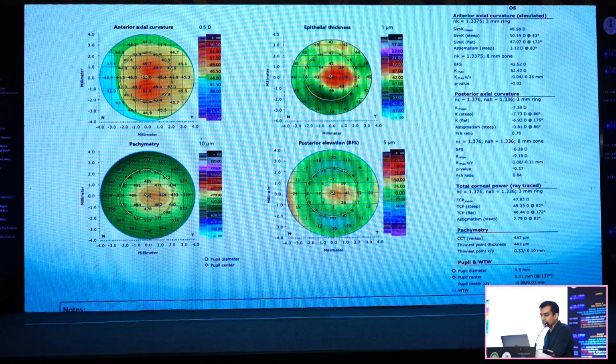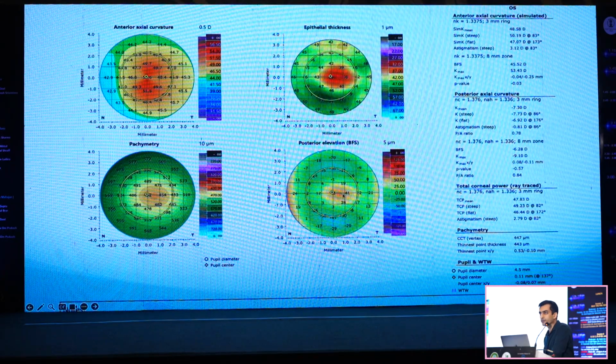While interpreting keratoconus, another thing which is important, which has traditionally been taught, is that if the thinnest point and the highest elevation of the posterior surface coincide, that is suggestive of keratoconus. Now with Pentacam, we had been looking at this: if the steepest Kmax, the thinnest point and the posterior elevation highest overlap, that means the cornea is most likely ectatic there. We were using epithelial thickness maps earlier, but unfortunately with Scheimpflug-based devices, epithelial thickness maps cannot be included in the same device. They cannot simply calculate the epithelial thickness.